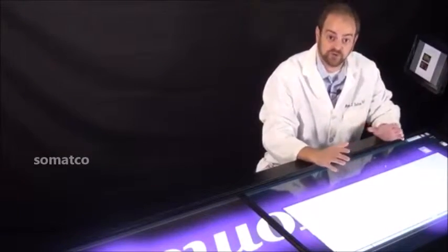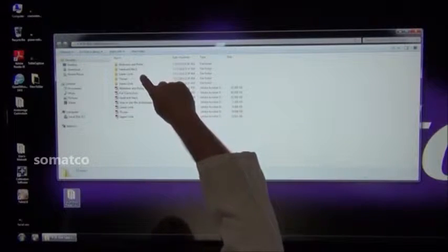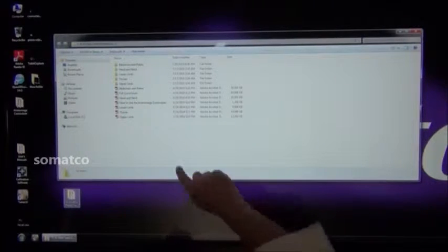This video is meant to serve as a demonstration of how to incorporate the curriculum into your teaching demonstrations on the Anatomage table. Within the table curriculum folder on the desktop, you will see it is subdivided based on anatomical region. Additionally, there's a collection of PDFs that will facilitate your instruction using the curriculum.